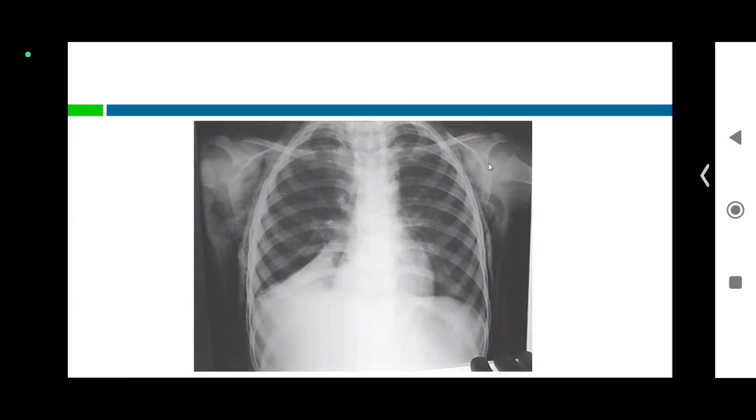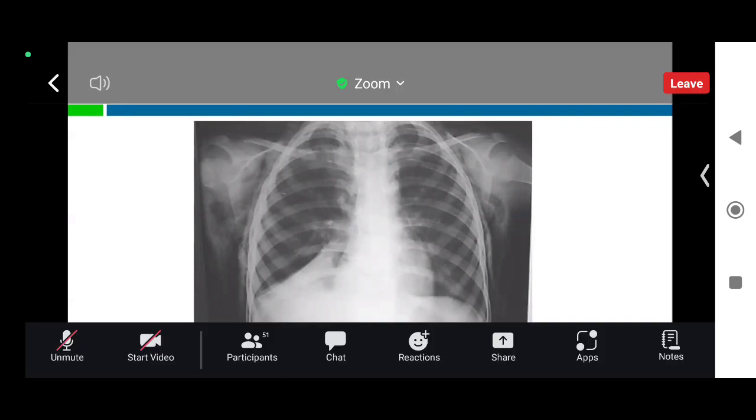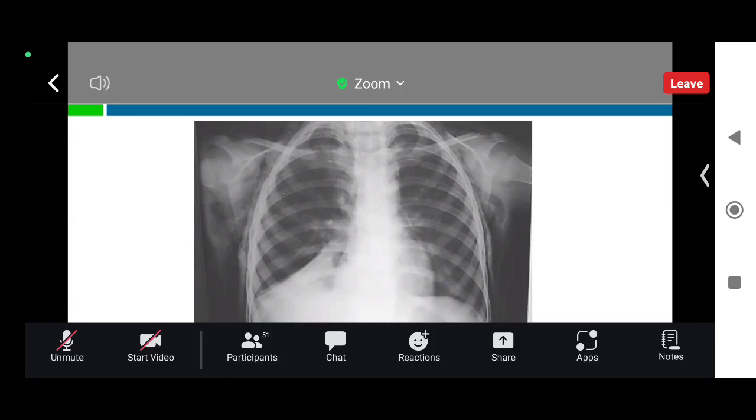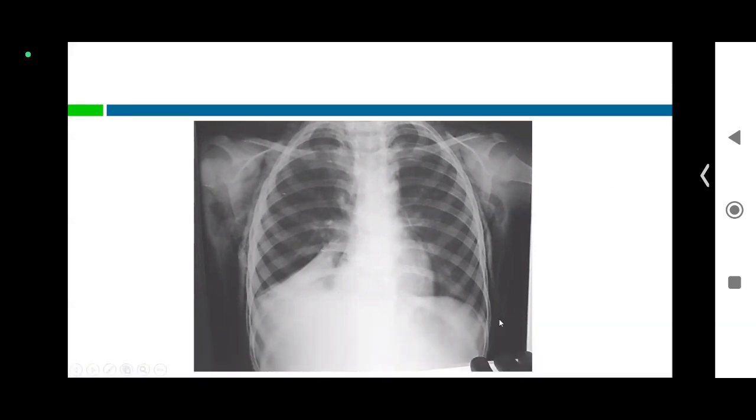Anyone wants to take a try on this X-ray? Same atelectasis, sir. One straight line is there, sir. Very good. Right lower lobe atelectasis, sir. Right lower lobe atelectasis is very good. Yes, anything else?